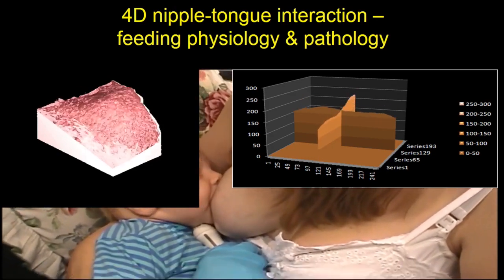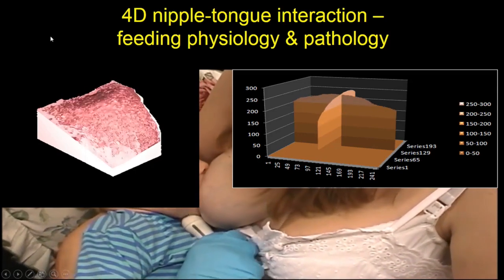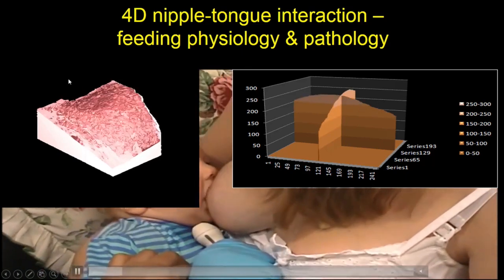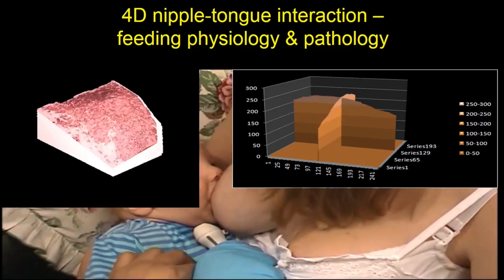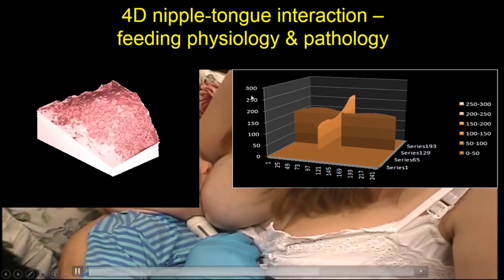That's probably a third. Who agrees this is the tip of the tongue here? That's probably just a tenth. The majority of people are probably not very sure.